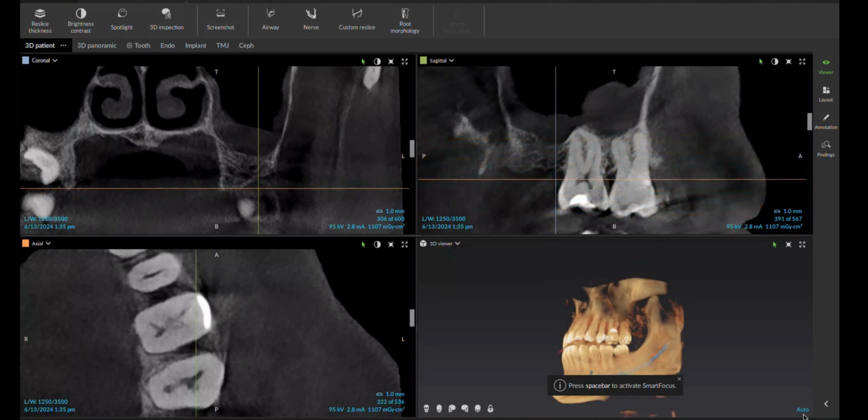All right, so let's just assume that you did that. There was nothing conclusive in the muscle exam, nothing wrong with the joint. Sometimes the joint can refer pain in this area, but it's pretty obvious what's going on here now that we have the CAT scan. So when I'm looking at the maxillary sinus, we want to take a look at the Schneiderian membrane to see if there's any thickening.